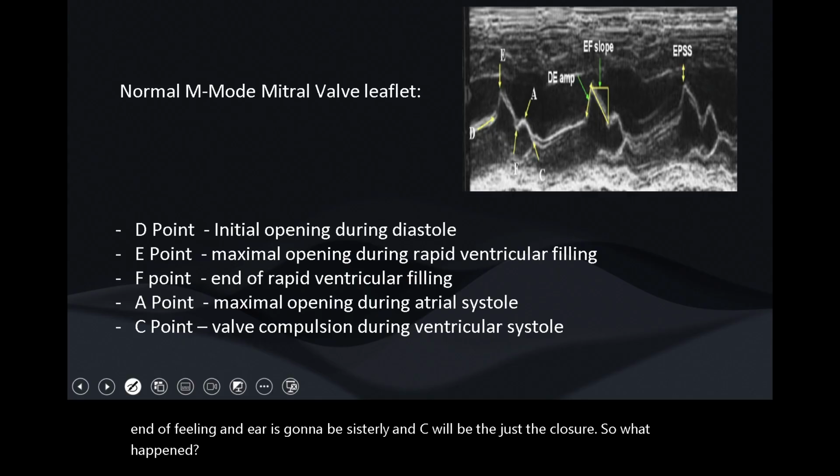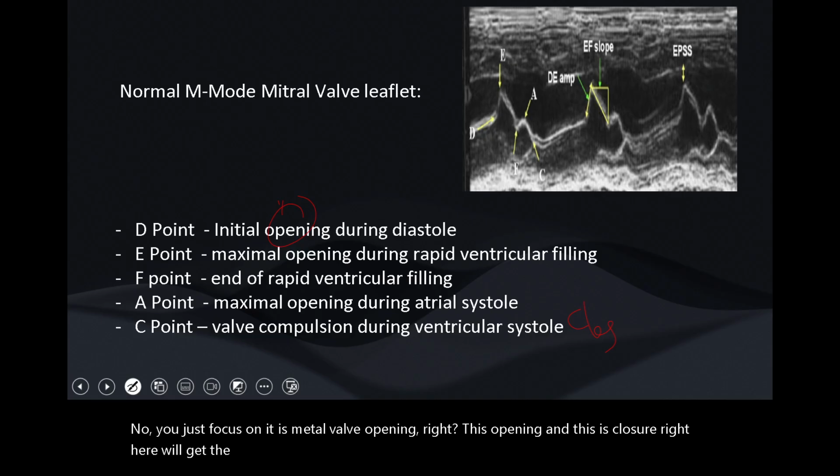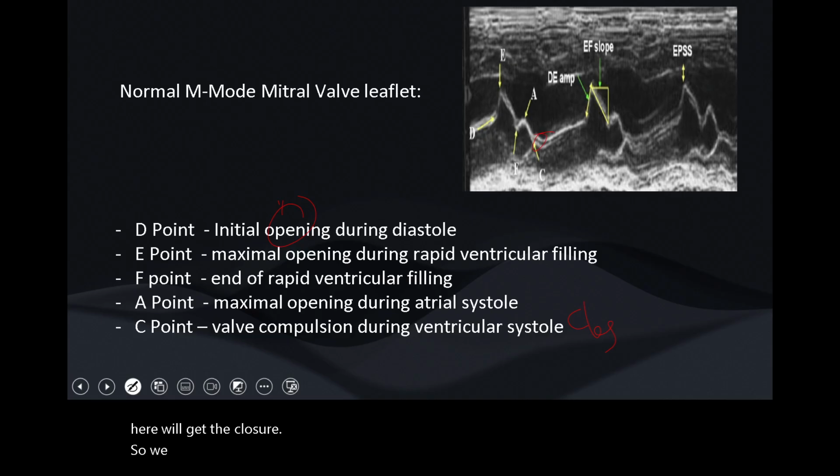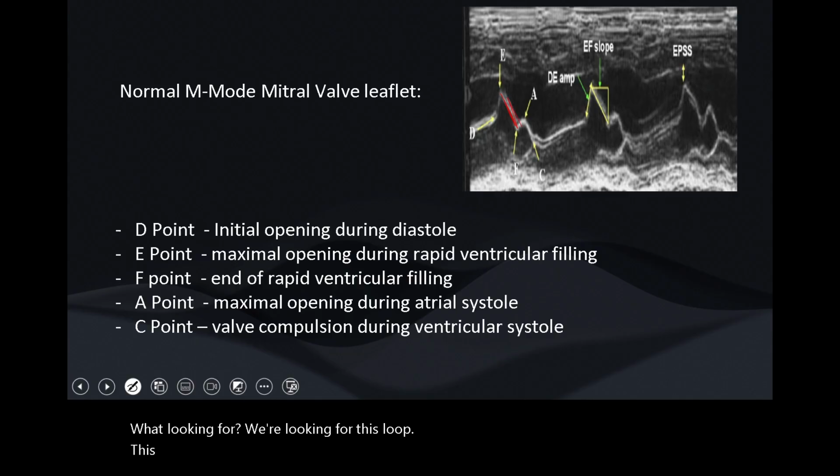Just focus on it: this is mitral valve opening, right? This is opening and this is closure. Here is closure, here is opening, right? Still, this is not what we're looking for. What we're looking for is the slope.